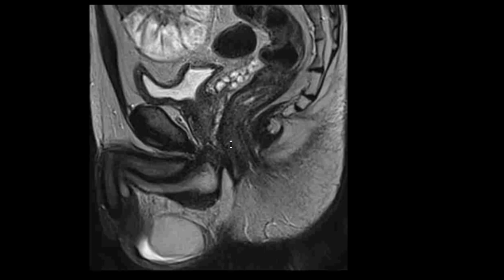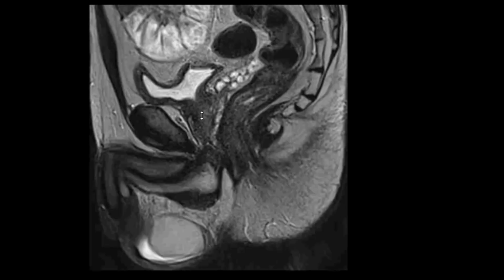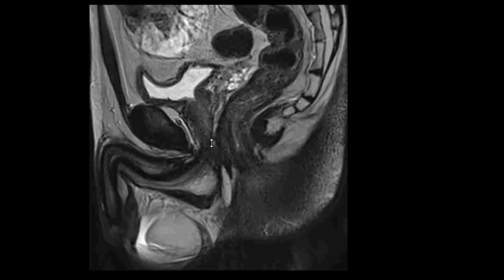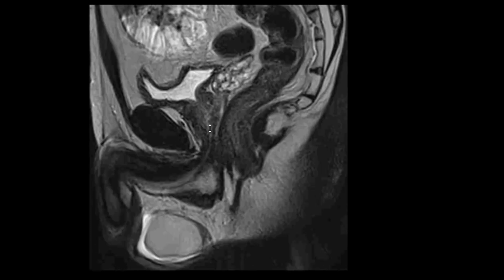While we're here, let's review the urethral segments in the male, which are divided into 4 segments. The first one is inside the prostate gland, and so here's the prostate gland inferior to the urinary bladder. And so the urethral segment within the prostate gland is going to be the prostatic segment. From the prostatic segment, we can see it here coming down.